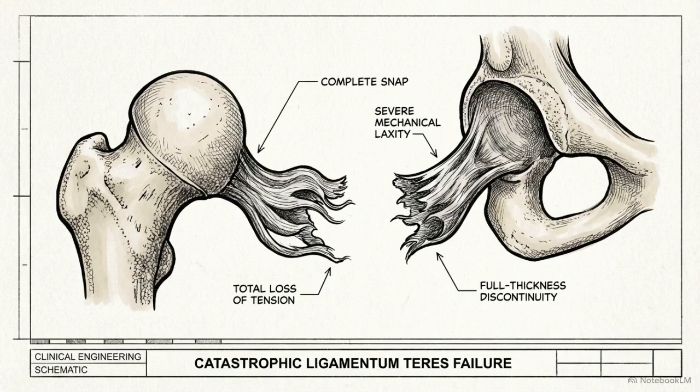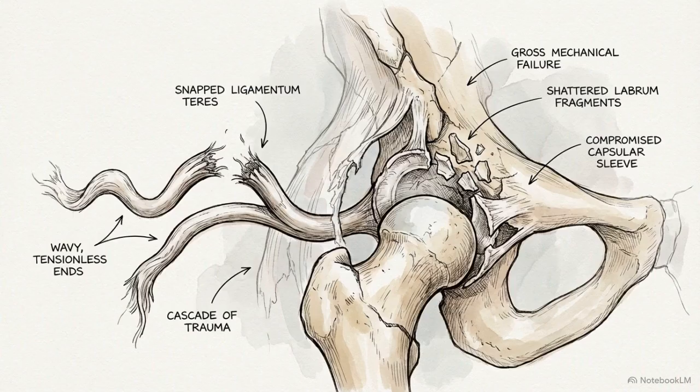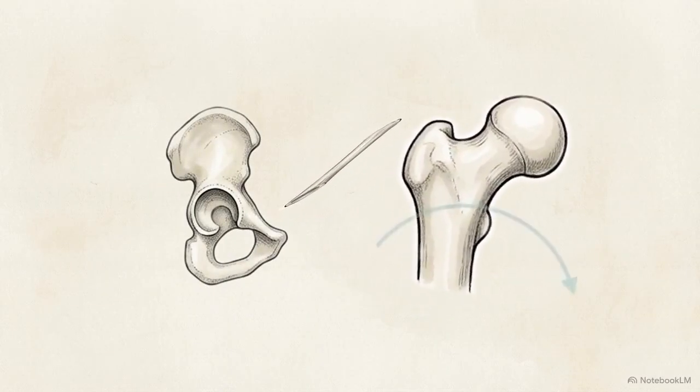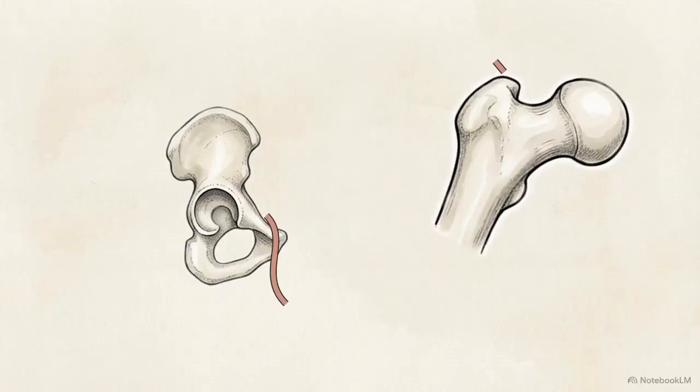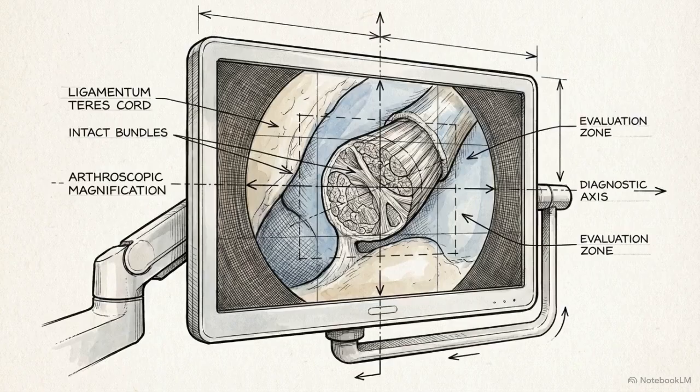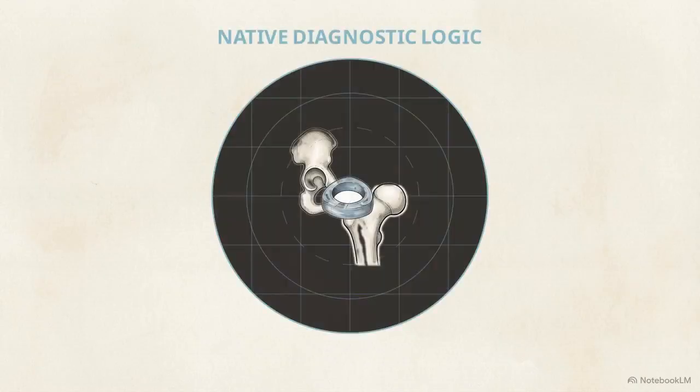These injuries rarely happen in isolation. They are frequently associated with complete hip dislocations or abrupt twisting motions involving heavy external rotation. As hip arthroscopy techniques advance, recognizing subtle ligamentum teres pathology on MRI has shifted from an academic exercise to a primary diagnostic priority for treating rotational instability. Evaluating a joint after surgery requires a complete inversion of diagnostic logic.